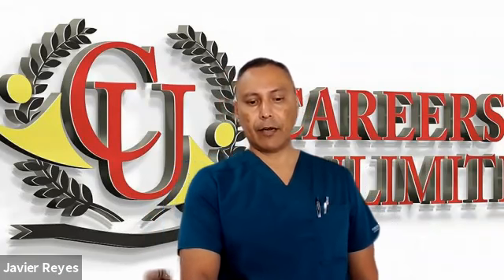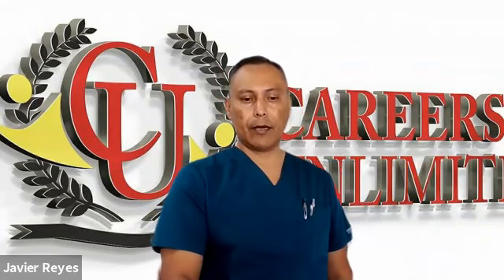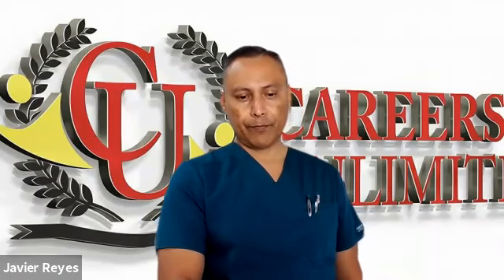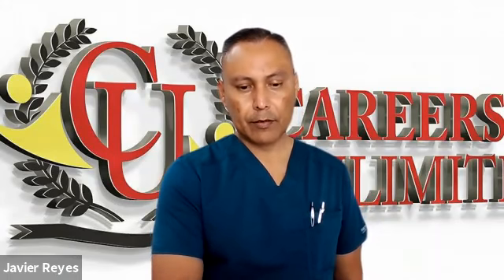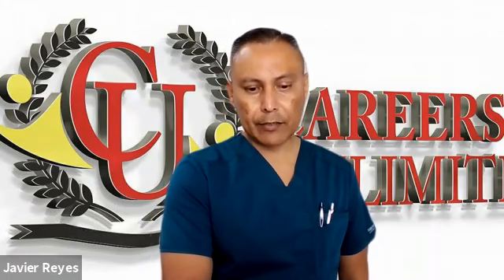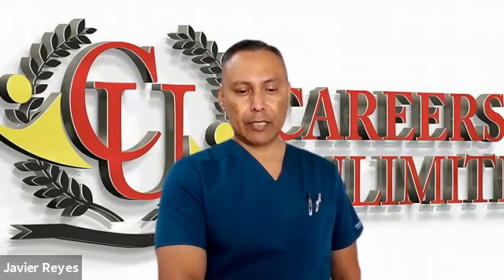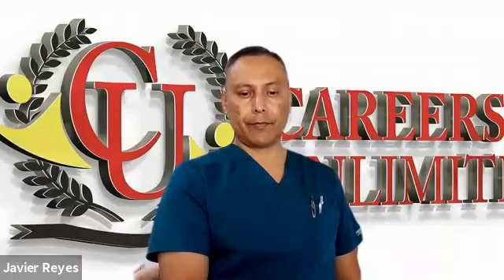So what's number 19? I forgot to mention that we're supposed to name the underlying rhythm. I didn't mention it earlier, but right now I forgot. So if you look at 18 again, you can see sometimes P waves, some of them are biphasic. Like the very first one on number 18, the P wave looks like it's inverted. And it's very small, but it looks inverted. So that would mean that it's an AV rhythm, atrioventricular rhythm.